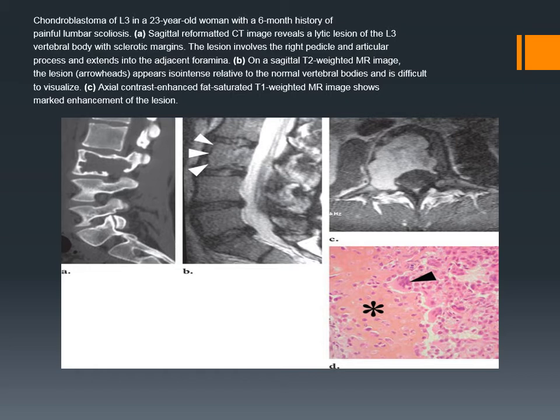Because it's not hyperintense. While we expect this tumor to be much hyperintense, the opposite is here. So you should keep in mind that it is unlikely to be a metastasis. Most of the other pathologies will be hyperintense. So now we have the remaining one, which is chondroblastoma. And when you give contrast, you can see the contrast enhancement and the extension into the surrounding spine.